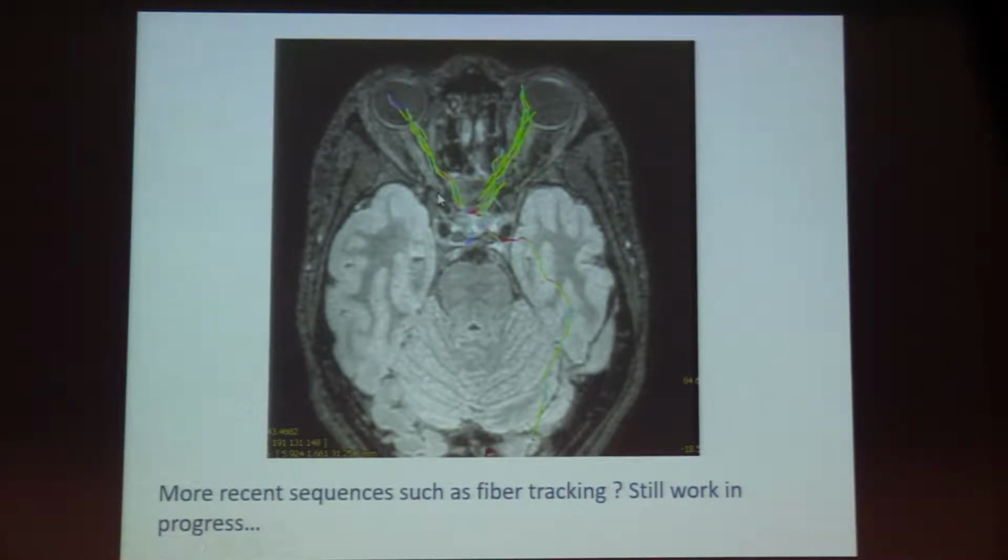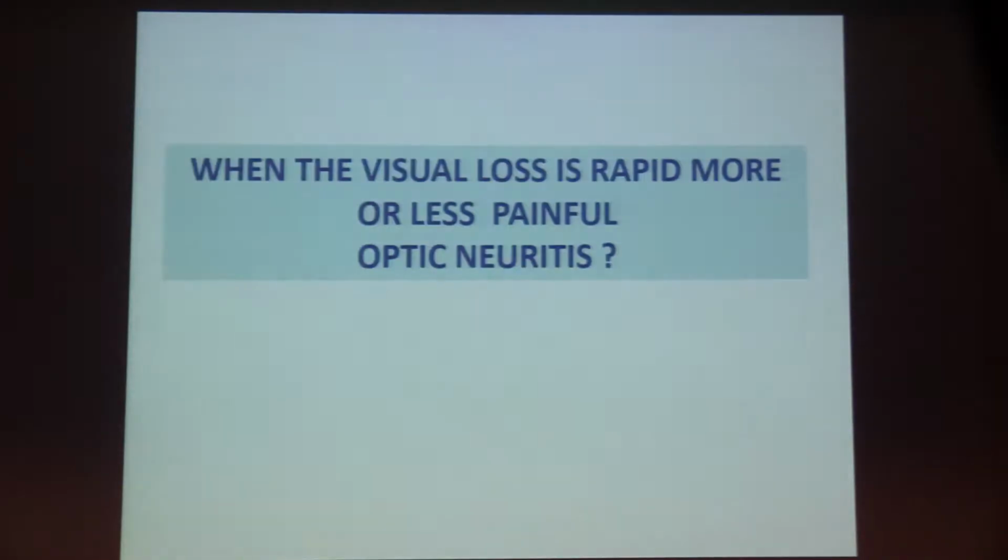We have other sequences. We don't use them in our routine practice. It is still a research field, and I think that in a few years it will be used perhaps in every protocol. But for the moment, for example, I show you fiber tracking. It's not useful at this moment.